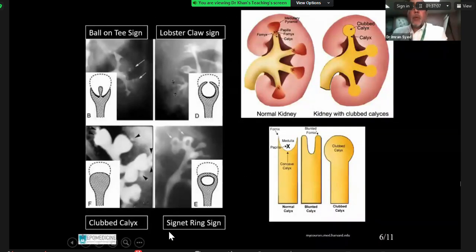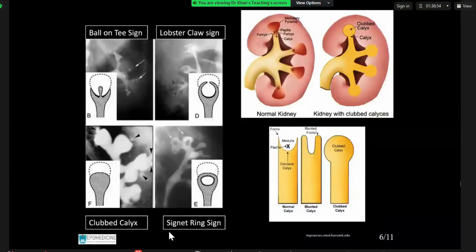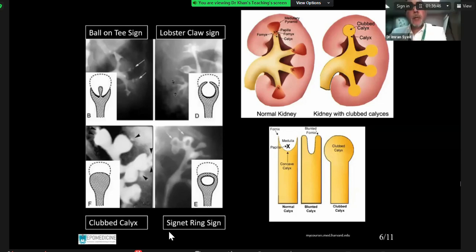Now, what we were referring to in the images on the CT was renal papillary necrosis. So what do you understand from renal papillary necrosis? So it's a result of ischemic necrosis, and you get a faint sort of filling defect in the contrast enhanced phase. Yes. Okay. And are you familiar with the signs?